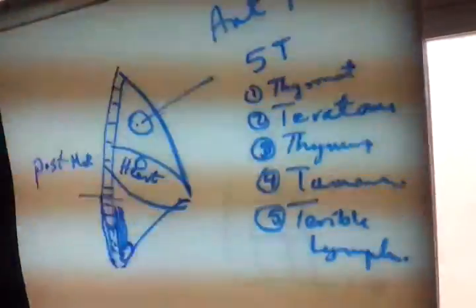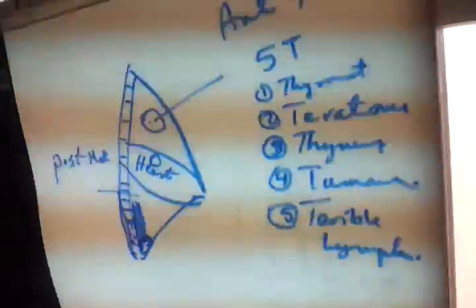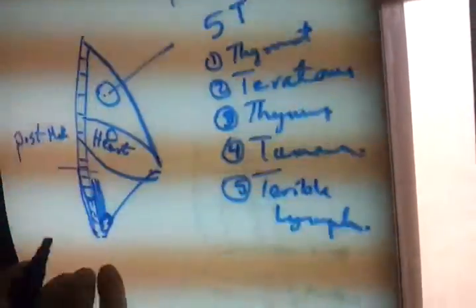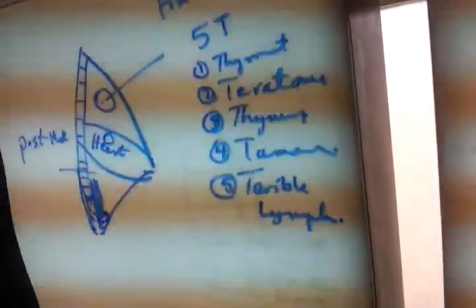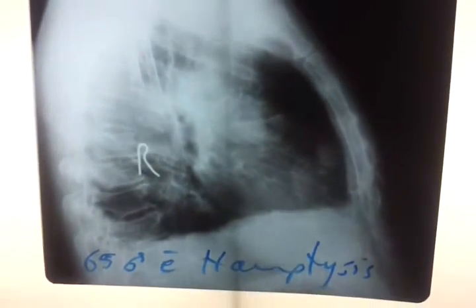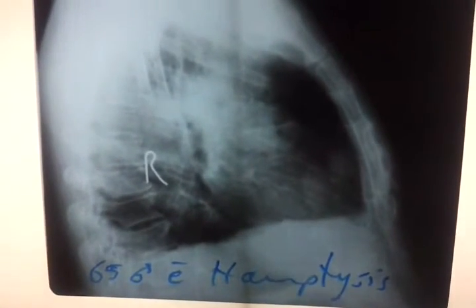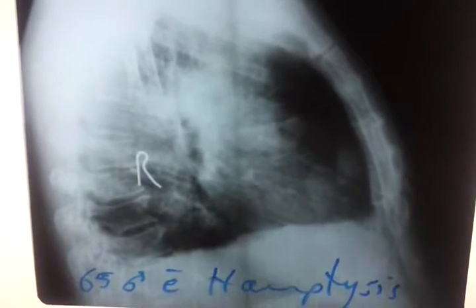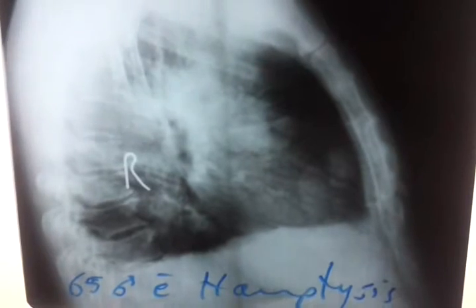Therefore, this is a lateral. Diaphragmatic hernia, usually on the left. I mean hiatus hernia in this area is usually left-sided. As we said in the previous lecture, any pleural effusion specifically on the left side means either esophagus or the aorta or pancreatitis.